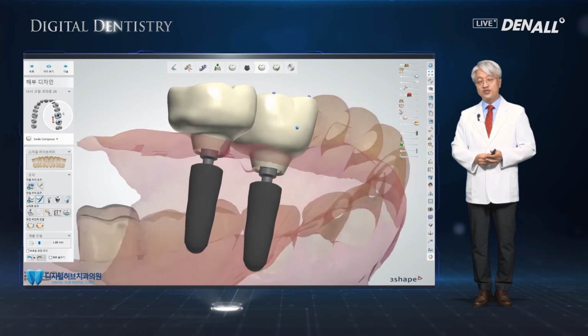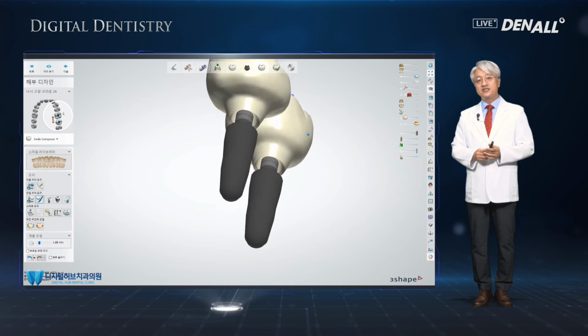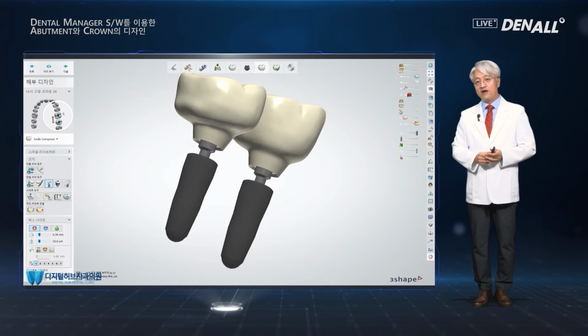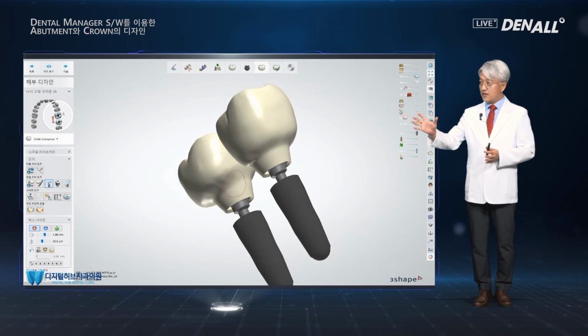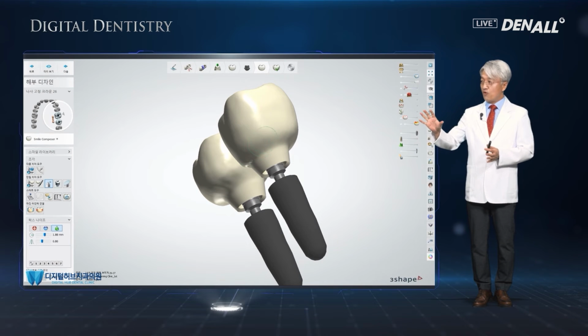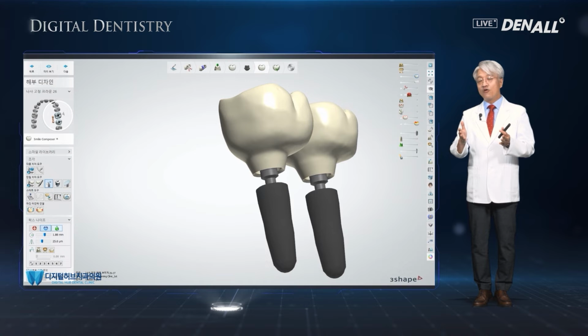If you do trimming or resin adding in an actual patient, it is a bloody environment, not very good. Using a handpiece is also presenting problems, difficulties. The rough gingiva shape and margin shape is checked. Trimming or adding at the connection part can be done to make an ideal and healthy gingiva shape.